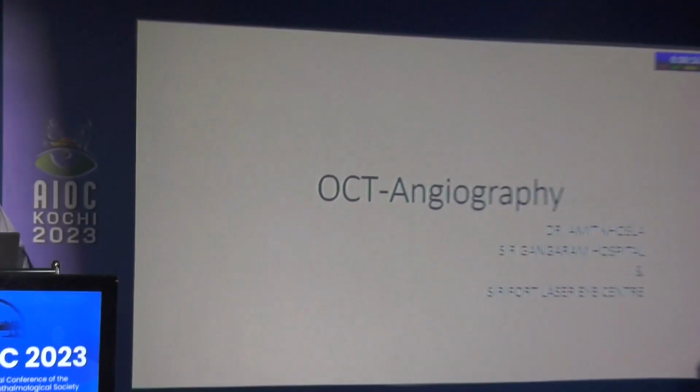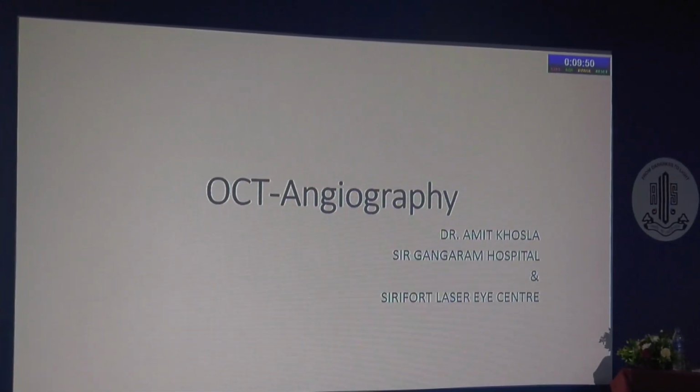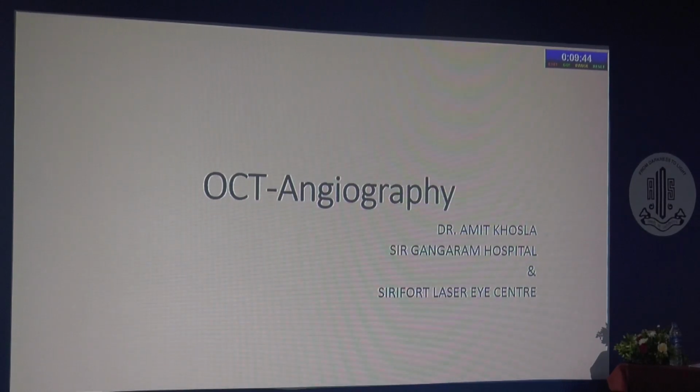So what I would recommend is, when you see an OCT, just give you some tips, you see four things. You see the normal contour. So even if you don't know how to read an OCT, just think of four things. What is the normal contour? Is it too dipped, thin, or elevated, as in an ERM?